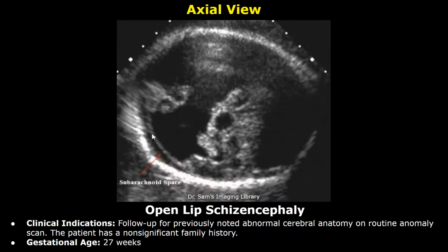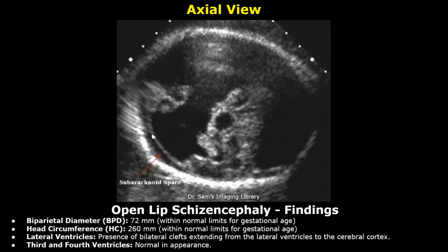Now we have a report of open lip schizencephaly. Clinical indication: follow-up for previously noted abnormal cerebral anatomy on routine anomaly scan. The patient has a non-significant family history. Gestational age 27 weeks. These are the findings.